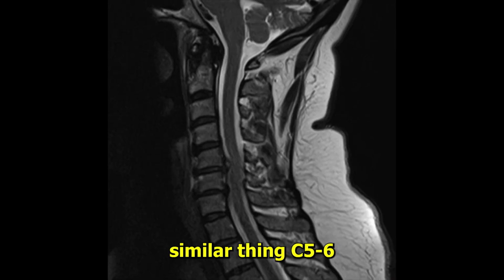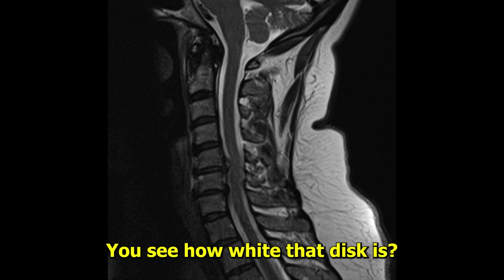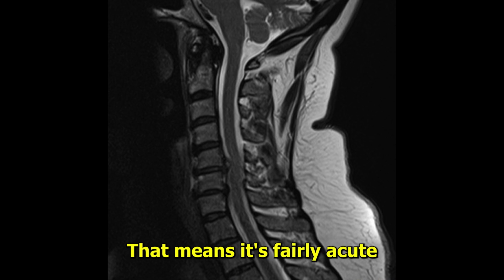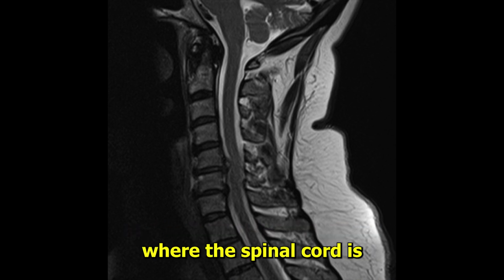And this next one is a similar thing, C5-6, but a big soft disc herniation. You see how white that disc is? That's a soft disc herniation. That means it's fairly acute, and it is distorting the sac, the thecal sac where the spinal cord is. See all the whiteness around the spinal cord above and below, and there's none here at C5-6 and C6-7. That's spinal stenosis. This needs to be fixed.